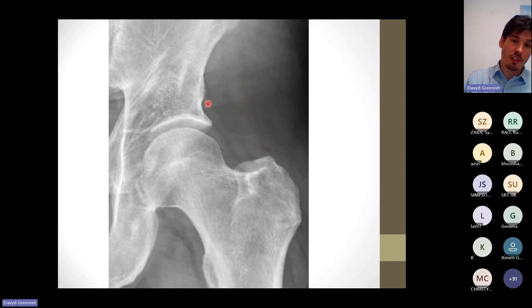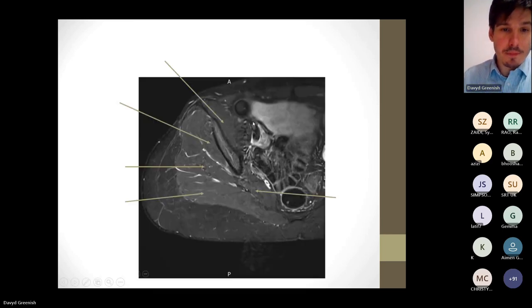So you can see that there is a bit of soft tissue joining, and a little bit of soft tissue coming up here and joining into the ASIS up here. Just make sure, this actually isn't the AIIS. This is a lateral margin of the acetabulum.